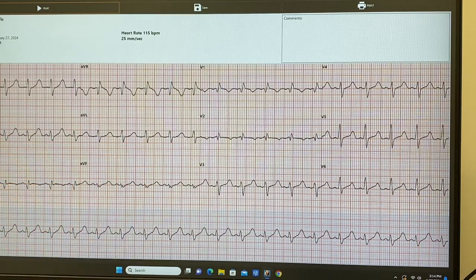Okay, what about your precordial? Precordial, that's your V1 through V6. Are they tall there as well? Yeah. Okay, so therefore, is it diffused or localized? It's diffused. So is it possibly an MI or is it hyperkalemia? Hyperkalemia. Okay, and of course we'll validate that with the blood draw, right? So far we have a hyperkalemic patient, right?